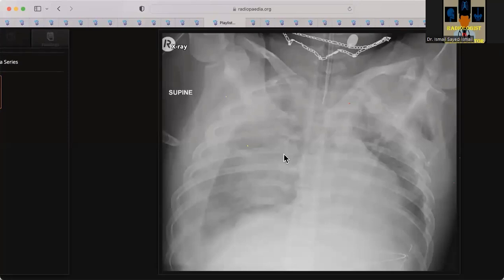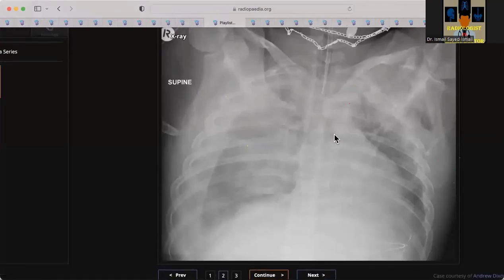Yeah. Okay, yeah. So can you see anything here? Just a bit of density here, more density? I think this is not density, not related to the surgical emphysema. I thought I was seeing some lucencies. I can't really see. Okay, so what's the number one thing that you'd really, you know, on these high motor vehicle accidents, what would you be extremely worried about?